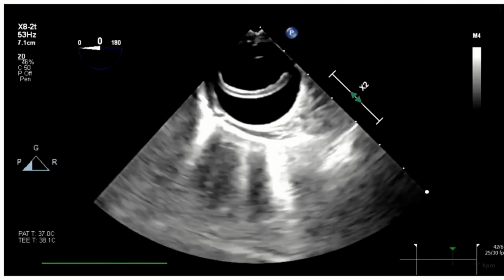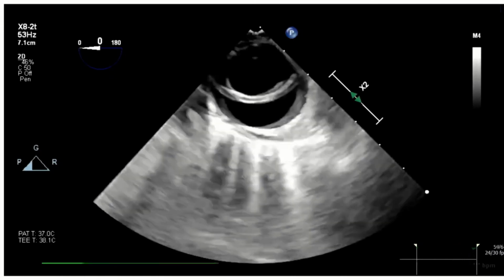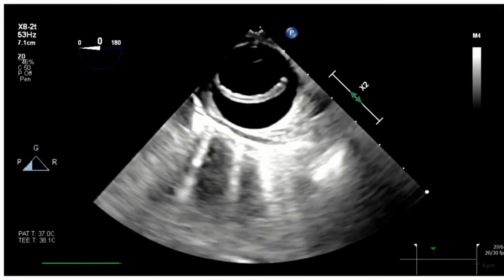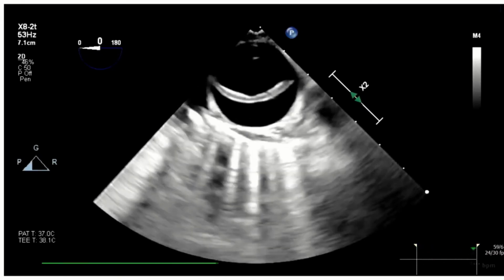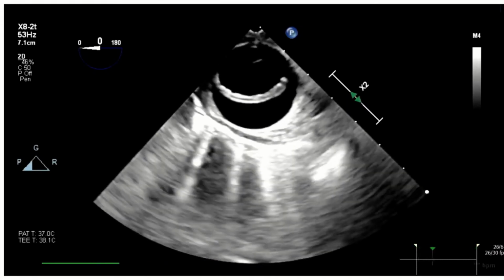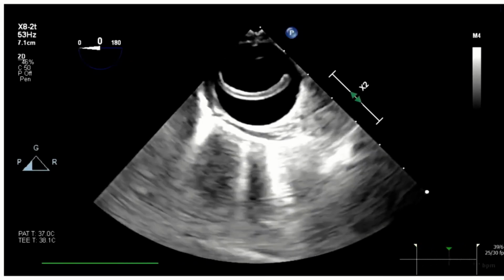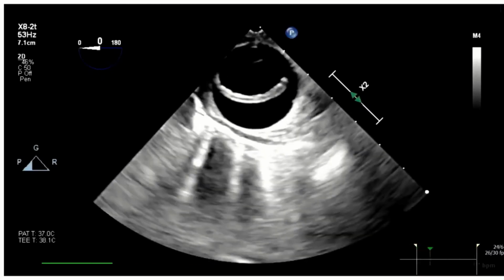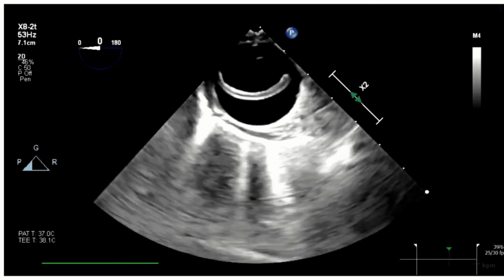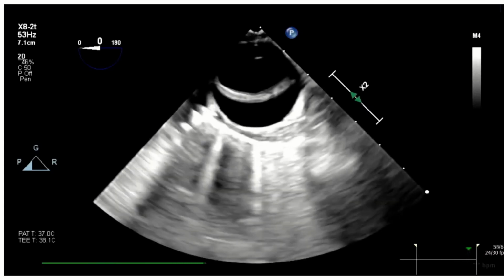This is how it looks in the aorta further down, just under the arch. So we know that this dissection actually went further, did not stop locally just in the ascending aorta, but continued down into the descending aorta. That little communication is there in the right upper corner. You can see that this is where it started, most likely, and then went up from there. So we can show with our imaging the entrance point, where it starts, and where it finishes. That really helps the surgeon and guides them on where and how to replace that aorta.